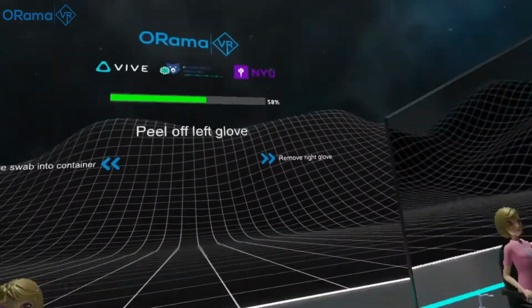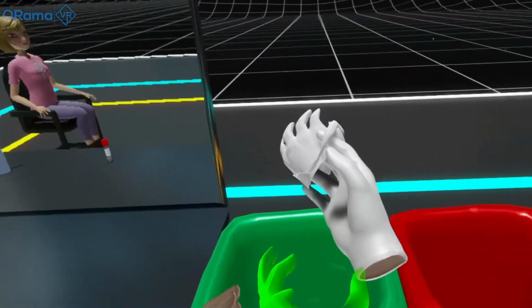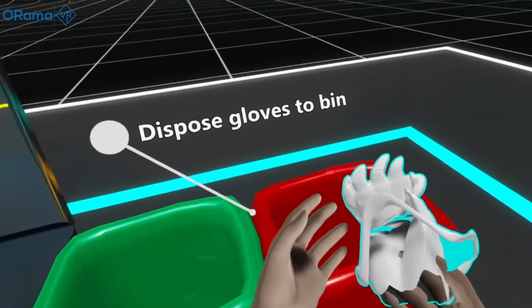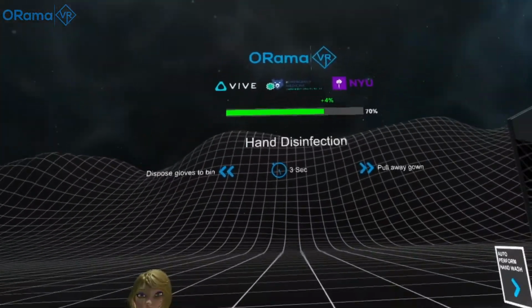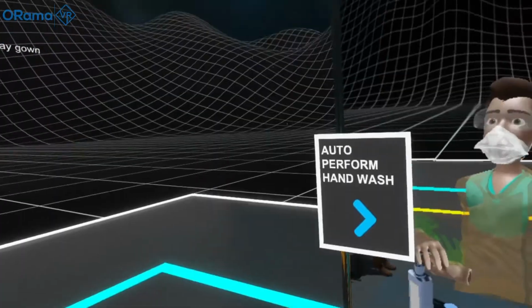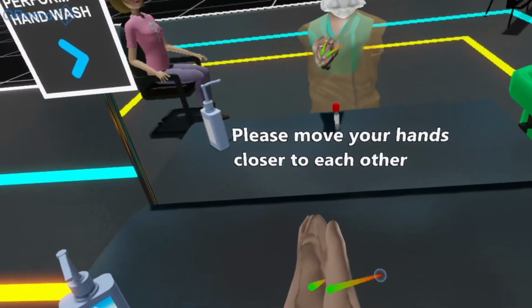What follows is doffing. The user will remove all personal protective equipment. At this point, there are two things one must have in mind. First, is to safely remove each piece of their PPE without touching the contaminated surface area. Then one must select what to do with the removed equipment: recycle or dispose it.